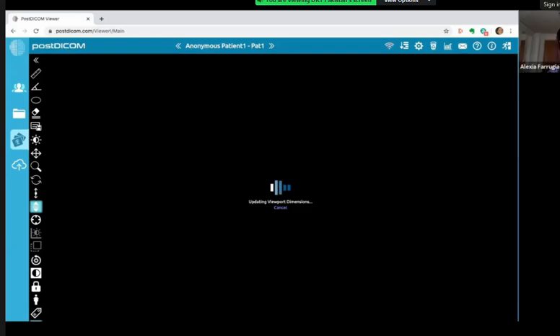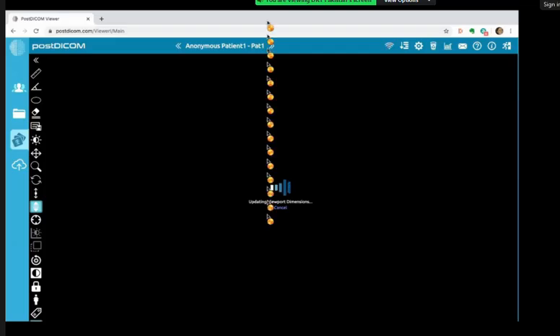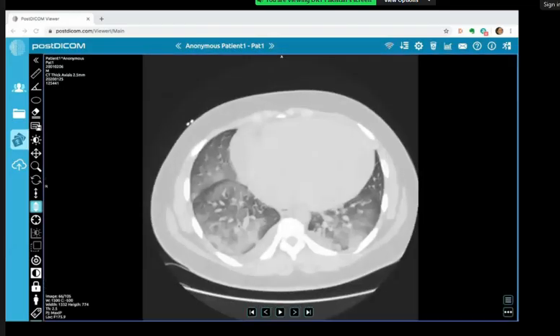I mean, again, going by the same theme as you initially suggested, ground glass opacification bilaterally in both bases in a young chap, I would be worried if there's some sort of pulmonary hemorrhage that's causing it. I mean, pulmonary edema would be in my differential because of the large heart as well. Cardiomegaly, yeah. And there is also some effusion on the right side, so it could all be related to a cardiogenic cause with pulmonary edema and effusion. Can't really think of anything else in my differentials.